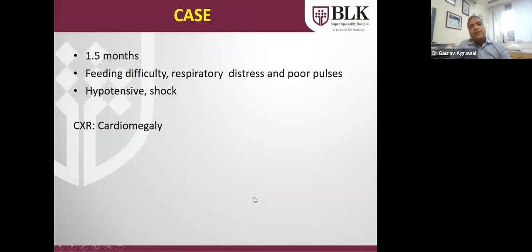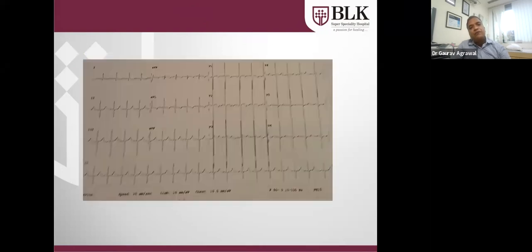Another case, 1.5 month old came with the history of feeding difficulty, respiratory distress, and poor pulses. Patient was in hypotension and shock-like state. X-ray again showed cardiomegaly with poor LV function. I'm sorry for the poor ECG quality, but you have to see these arrows.